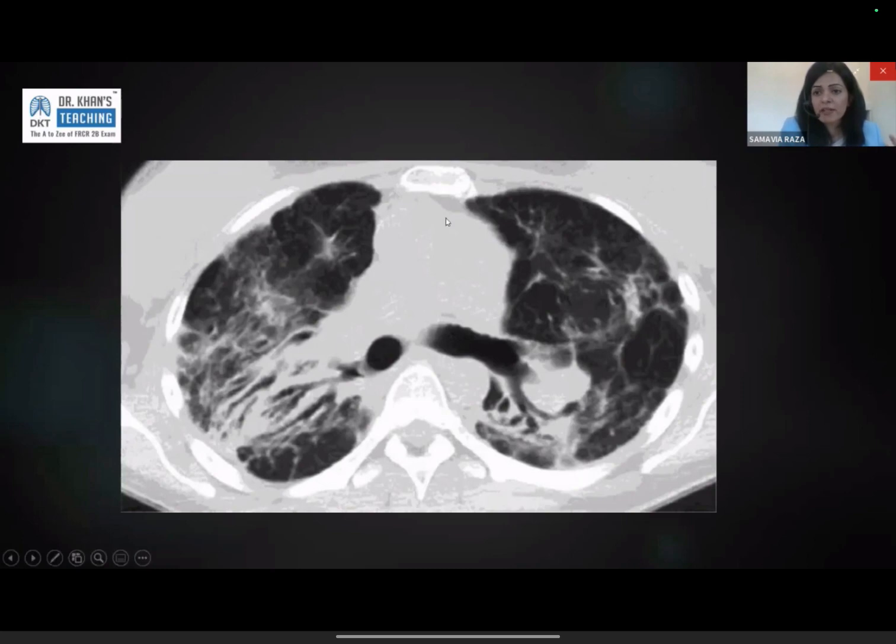Can it be PMF? Yes. Sarcoidosis does not cause PMF. No. So PMF is progressive massive fibrosis. For those of you who don't know, this is commonly seen in occupational lung disease. So the posterior pulling is not specific to PMF. PMF can happen anywhere. Wherever that massive fibrosis or mass-like fibrosis is, it's going to pull towards it. So that PMF can also be in the lower lobe. It can be all over. It's predominantly upper to mid zone, but it's not specific to posterior architectural distortion.